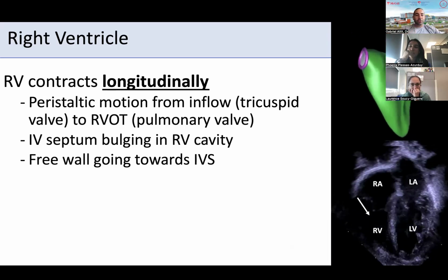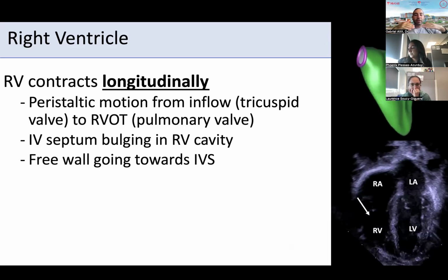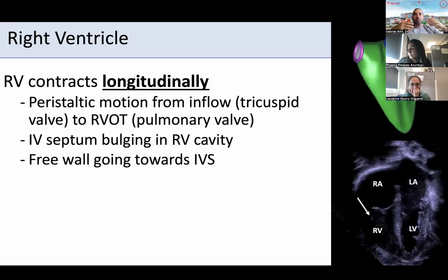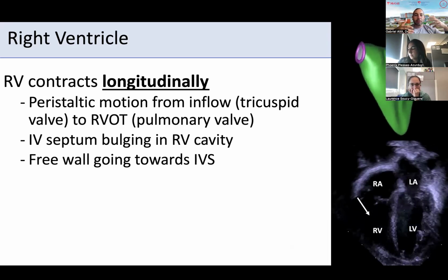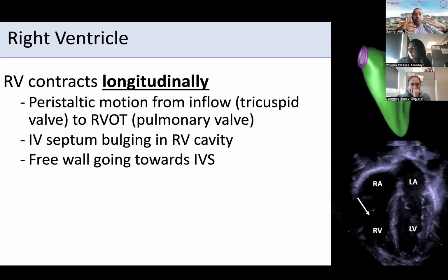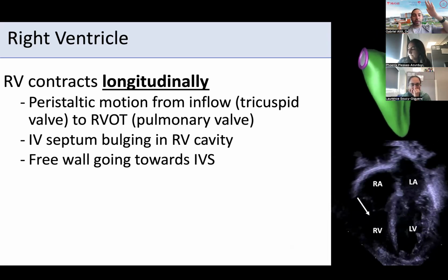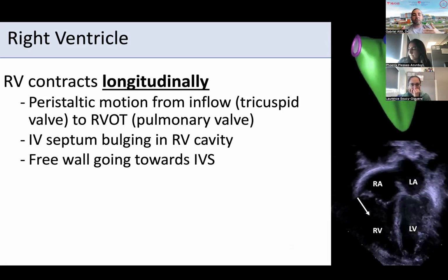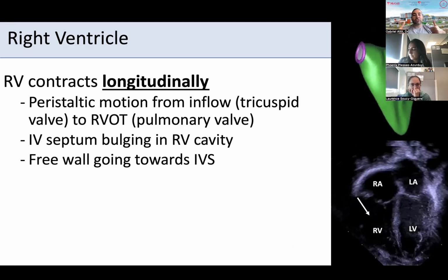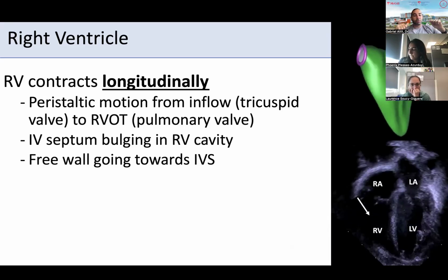Now, if you have a lot of atrioventricular valve regurgitation or insufficiency, think about a tricuspid valve that is very regurgitant, in diseases like Ebstein's anomaly or other issues with your tricuspid valve, the RV may look like it has really good function, like it's contracting well. But that's because during systole it's ejecting most of this load into the RA, which is a low pressure chamber.